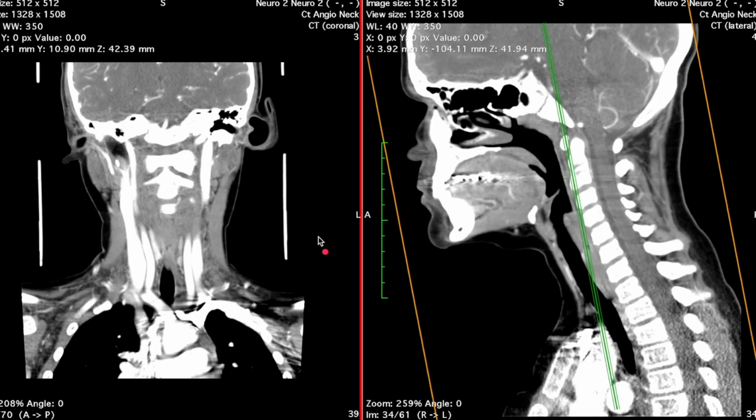Now we're going to jump into the vasculature for today's lab, and I'd like to first talk about the arteries that we need to name. These arteries are not going to be the most complex vasculature that you'll see in your anatomy labs, but I do think they're super important because today we're going to be talking about the branches that come off the aortic arch and following those out a little bit more as they extend throughout the body.